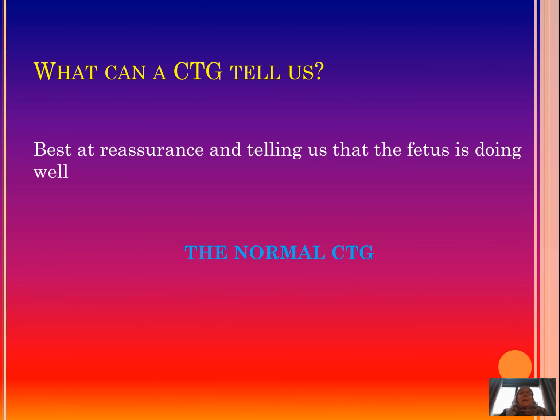But a normal CTG is very reassuring, and it tells us that the baby is doing well at this moment in time. And this is the real benefit of a normal CTG, and this is why it is very necessary to recognize when a CTG is normal. Recognizing a normal CTG also means that you will recognize when a CTG is abnormal, and this is why we are going to focus on the normal CTG in this presentation.